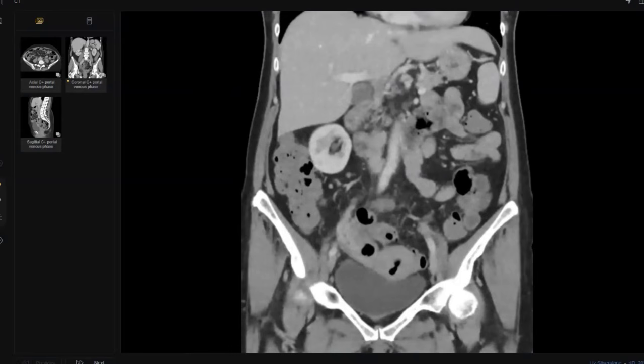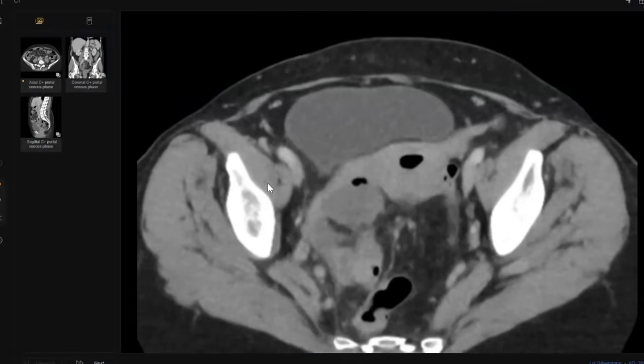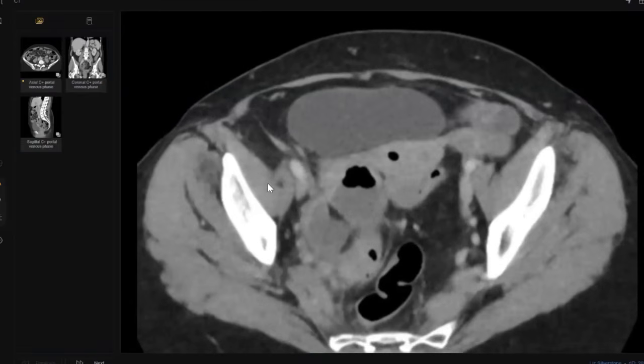Doctor, if you wanted to tell the IR or the interventional radiologist your opinion, do you think or don't you think this abscess can be drained by ultrasound guided or CT guided? Is there any benchmark of the size of the abscess? I think the size of this abscess, if it is more than 5 centimeter, it could be tackled by possible CT guided tube drainage.